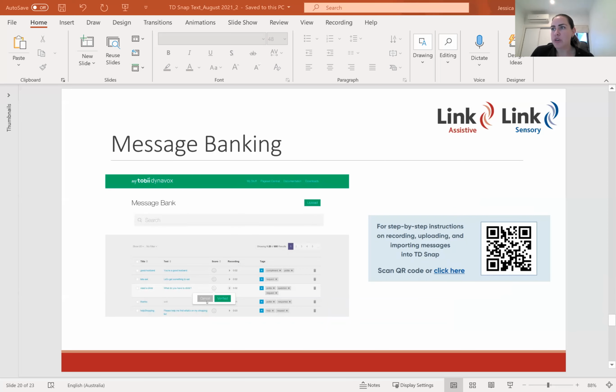And just a final consideration, often in this population of progressive neurological conditions, is message banking. Message banking is a way to preserve your natural voice before you develop significant speech difficulties. It involves creating digital recordings of your voice speaking words, phrases, and stories, and then importing them and using them with your AAC system.